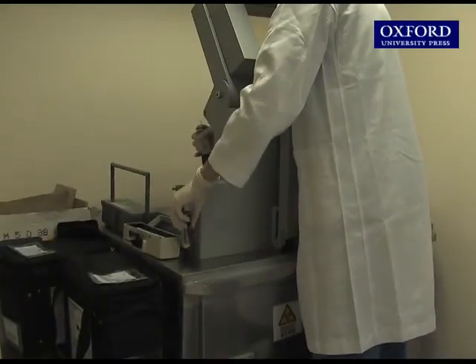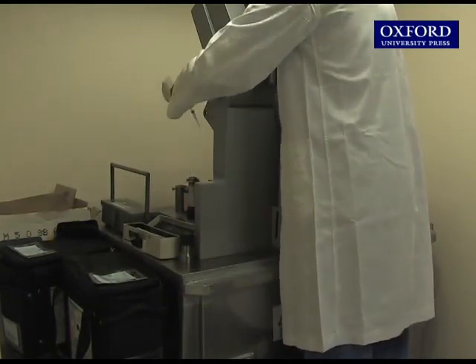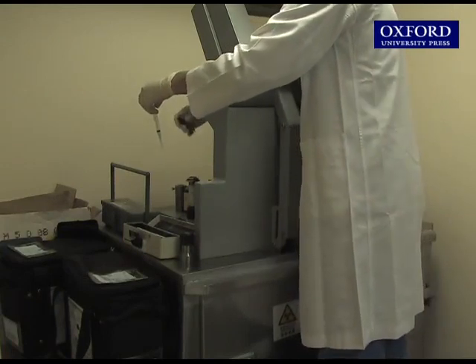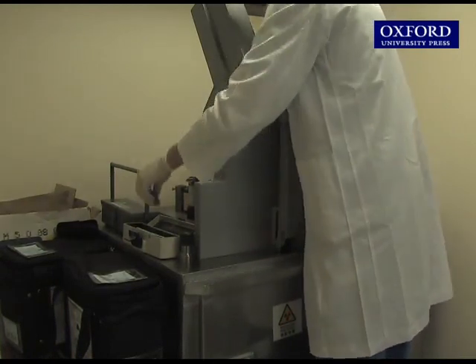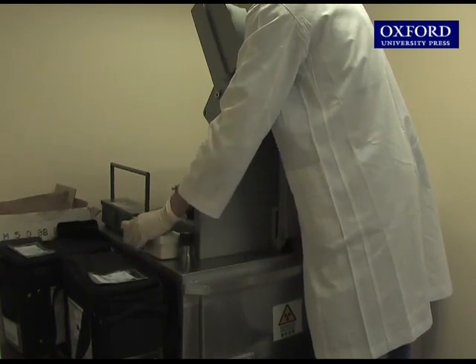The radioisotope tracer is stored inside a lead canister and will only be taken out when it's in use. As the tracer gives out gamma radiation, the member of staff taking out the tracer has to stand behind a lead protective shield during the process.